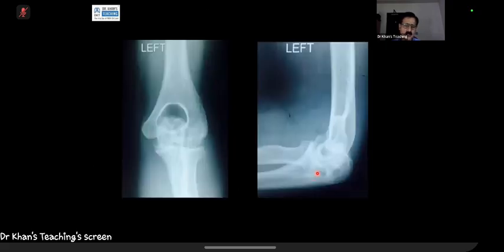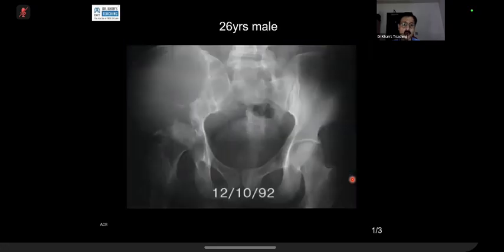Another example where you can see, look at this olecranon process, and it has got an expansile lytic lesion. And the head of radius is slightly enlarged. There is secondary OA, and this lucency actually is projecting here also. And this is again because of intraosseous pseudotumor. How do you describe this case? Over to you, candidate 3.